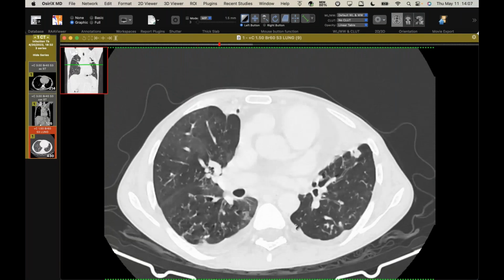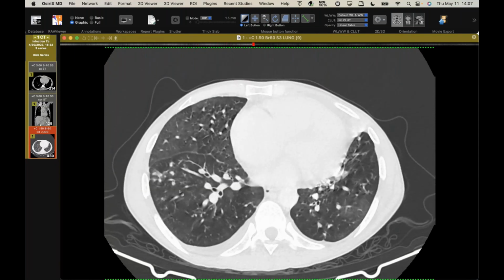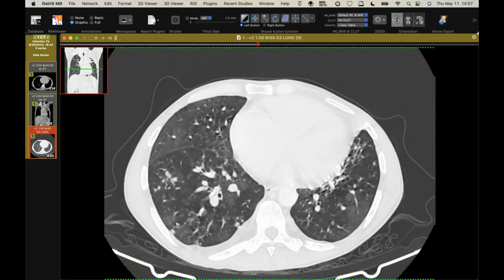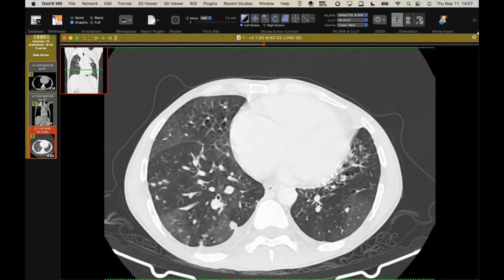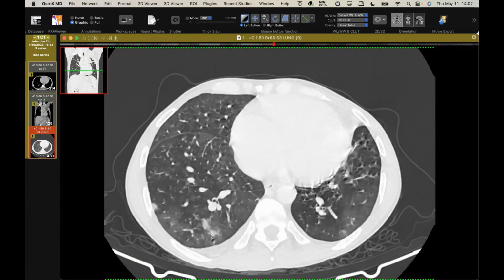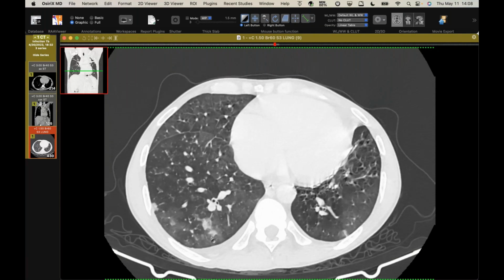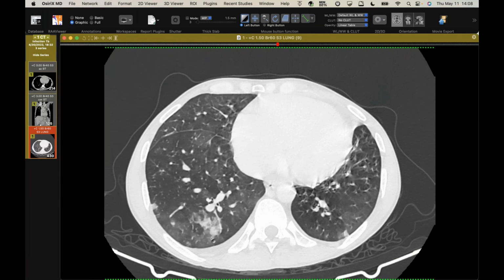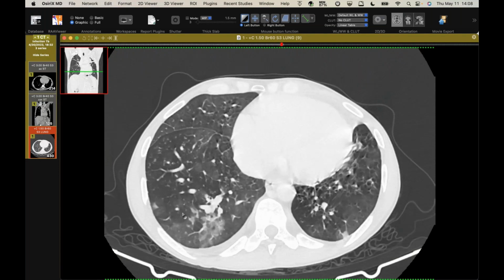And so the important finding in this case is the presence of new small airway nodules out away from other areas of abnormality. You see some air trapping, but that's about it. The point of this case is it's difficult on imaging to determine if there's active tuberculosis, but one finding that has been shown to be suggestive of it is the presence of tree and bud or centrilobular nodules in the lungs, particularly if they're a little bit away from other things, because it suggests there's mycobacteria spreading.